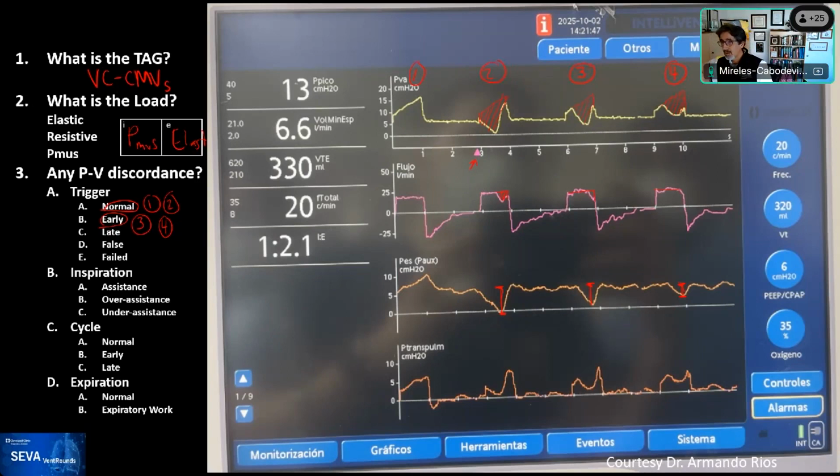And remember, in the common literature, this pattern is very consistent with reverse trigger. That pattern is triggered by sedation, awakening on our patients, highly common in our ICU. So I see already Simran and Trish said, stop the sedation. And then Alicia comes in with a punch. And I love when Alicia comes with the punch.